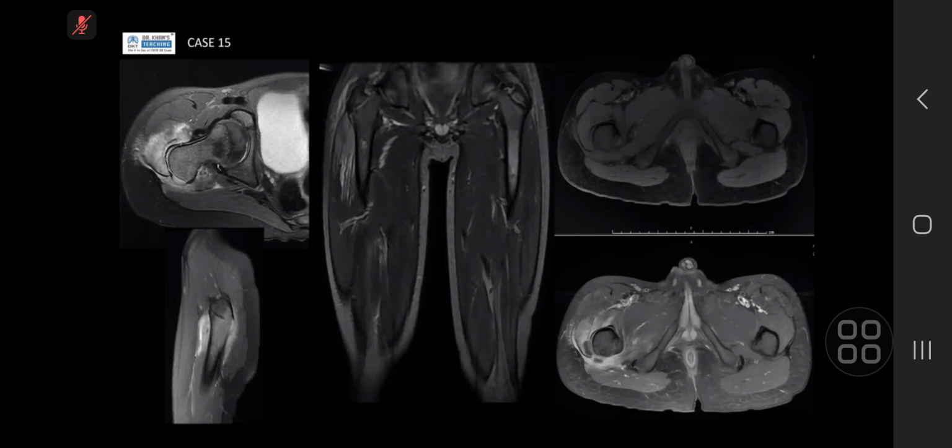And on post-contrast, there is enhancing well-defined collection seen, 2 collections. And can I have a clinical history of the patient, please? Right leg pain. Does he have fever or anything? Yeah, he's got a fever. ESR elevated. CRP is 70, white cell count 25.